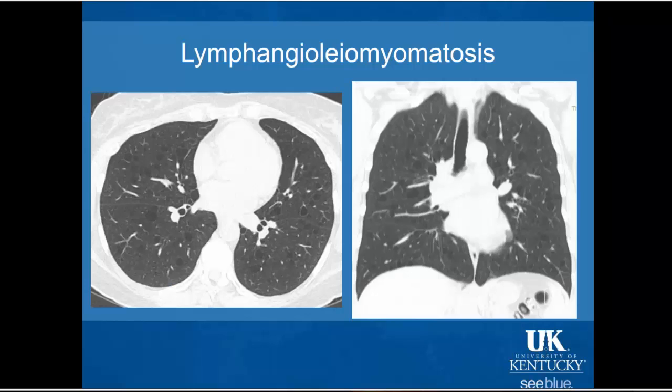So here's a case. On CT, axial, and coronal reformats, we see very pretty, discrete, thin-walled pulmonary cysts. So these cysts have discrete, small, thin walls, right? These are not areas of cavitation that are thick and irregular. These are nice, clean, relatively regular-sized, thin cysts. In the craniocaudal plane, on the coronal, we see they're diffusely distributed throughout the lung parenchyma. These are classic LAM appearing cysts.